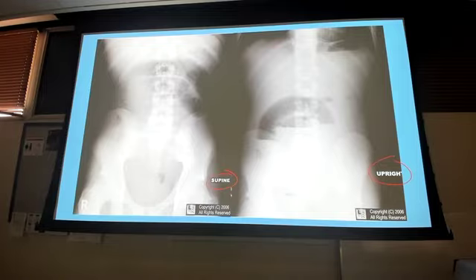You might be able to turn around and go, well, let's look distally, right? Well, guess what? Look, I still got some air down here. I got a little bit of air. Maybe you caught it early on, right? And so with the small bowel, I need to give you hyperactive, hypoactive, or maybe I don't give you that. I give you the history. Surgery 36 hours ago, surgery 6 months ago, 5 months ago, 8 months ago, something along those lines to help you distinguish between ileus or obstruction.